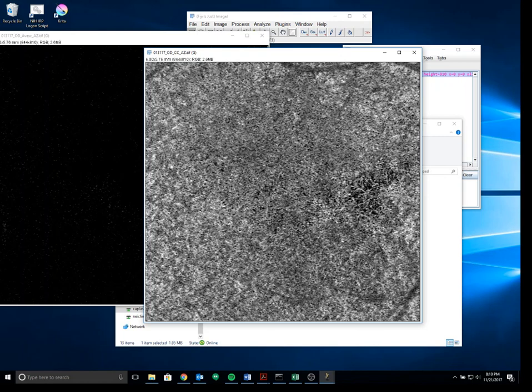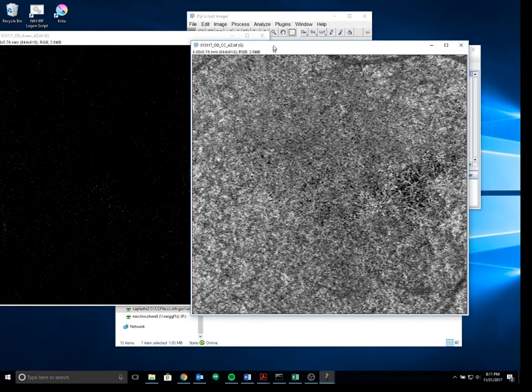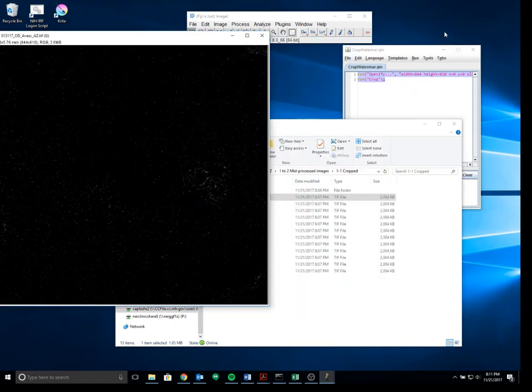And when it's quantified as black here, it will highlight it and call it a flow void. So you're essentially using the avascular zone to determine what is avascular in the choriocapillaris. And any areas that are avascular in the choriocapillaris are in this case assumed to be a flow void. So that's sort of the concept behind it.